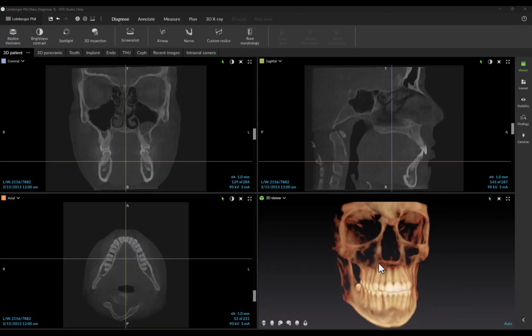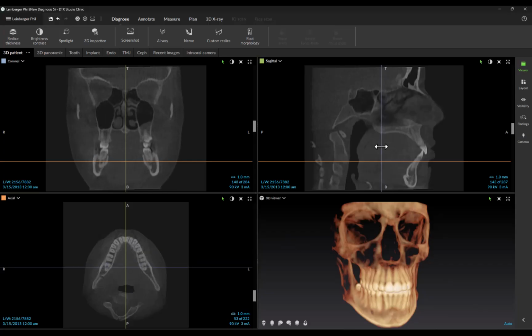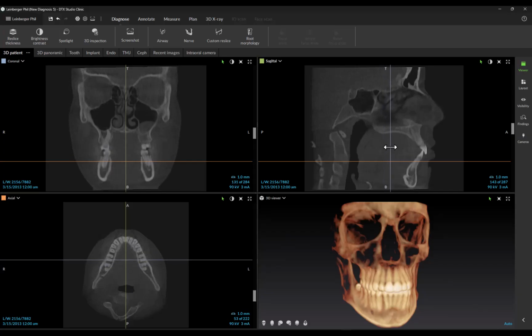Okay, so this is the iCAT Flex CBCT, and in this scan we captured a Quick Scan Plus volume, which is the lowest dosage option of all the types you can capture on the iCAT. And right from the jump you can see the resolution is definitely a lot less than what you might be used to for certain applications. But for many orthodontic applications, not all, it's more than enough. Many of those applications, you're just looking at macro information. And the dosage is super low, which makes it nice.